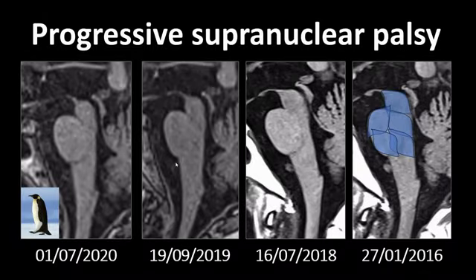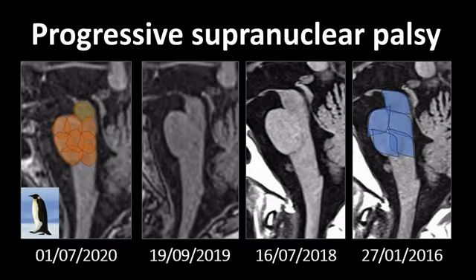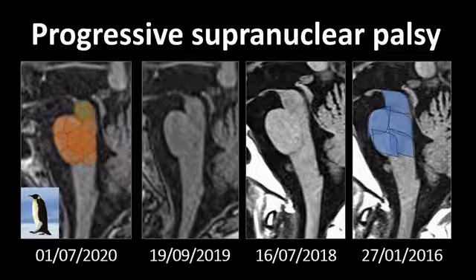And when does midbrain atrophy become very specific for progressive supranuclear palsy? If your midbrain fits about 8 times in your pons, if you can eyeball that, or if you measure it and your ratio is smaller than 0.125, then it becomes specific. Now there's a large area in between that is a gray zone, because the midbrain can also become atrophic due to some age-related atrophy.